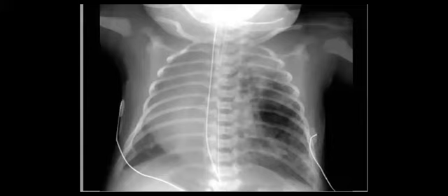So the cystic appearance, cystic mass in pediatric, you are going to mention CCAM, congenital pulmonary airway malformation, which is hamartomatous proliferation of the terminal bronchioles. And you know that it can be many types. The most important differential will be the diaphragmatic hernia. So look at the continuation of the diaphragm, if there is any continuation or interruption of the diaphragm or not.